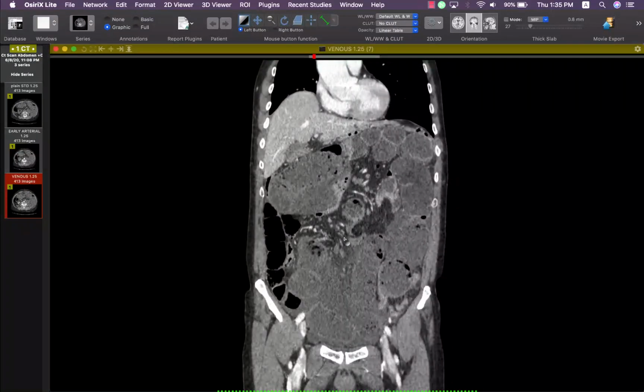We can clearly see this is the region of the defect, or the hernia orifice, pointing along the mesenteric fascial plane. So if this is an internal hernia, it will usually be the transmesenteric type.